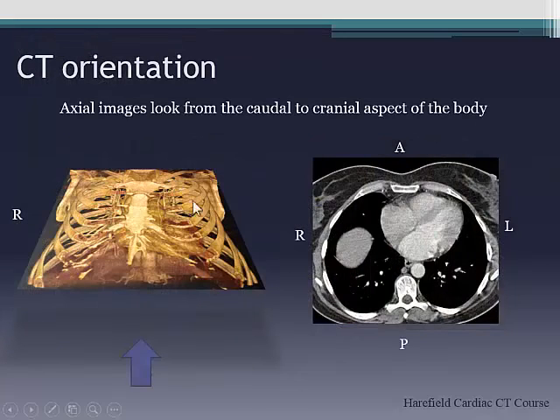Okay, so remember from the axial image, as Taryn's already said, you're looking effectively from the feet above. So what you have to remember is anterior will be forward, posterior will be back, and right and left as per chest x-ray.